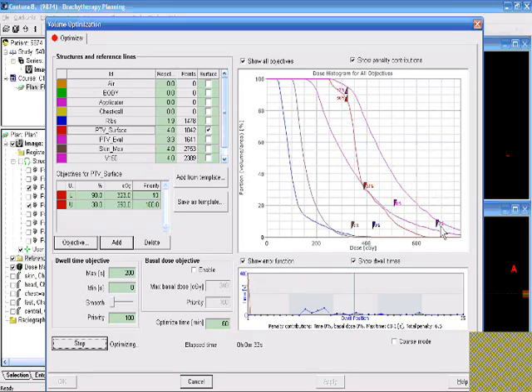You can also tell, perhaps, that these points are being evaluated on this line, not on this line this time. Because remember that we didn't put them as percentages of the eval this time, but as percentages of the V150 evaluation. And unfortunately, the colors of these are very similar, so that could be a little bit confusing. But you can see that they're getting an error of 0%, meaning that they're associated with this line here that's below them rather than this line here. But it looks like those are going to be okay.